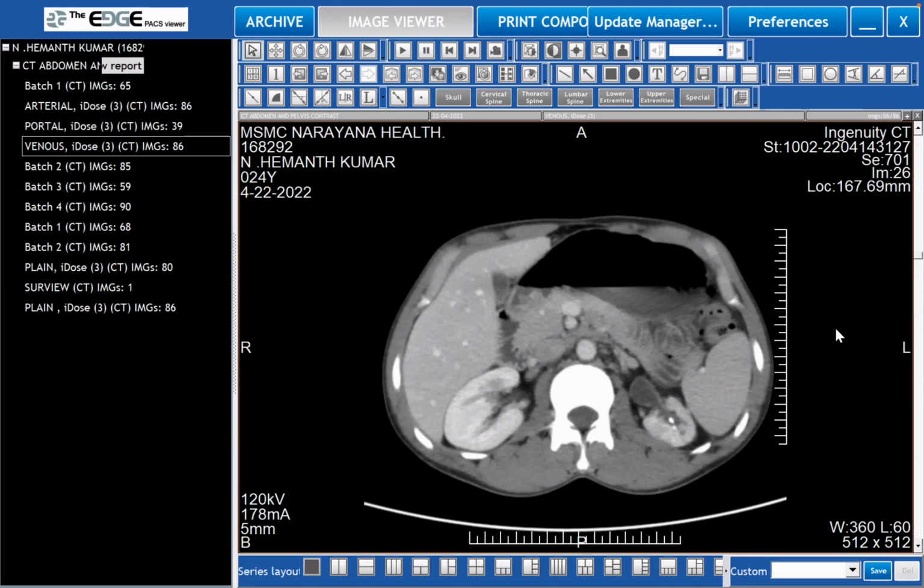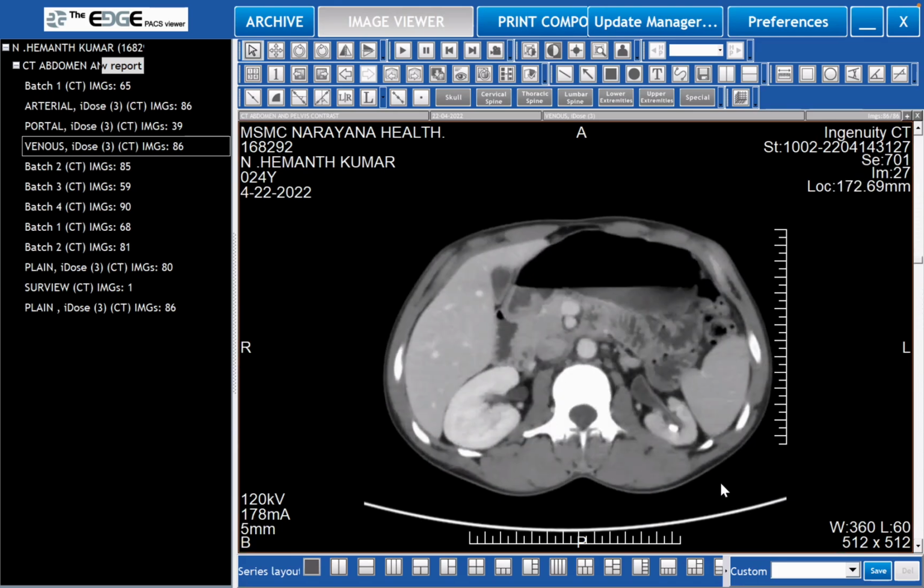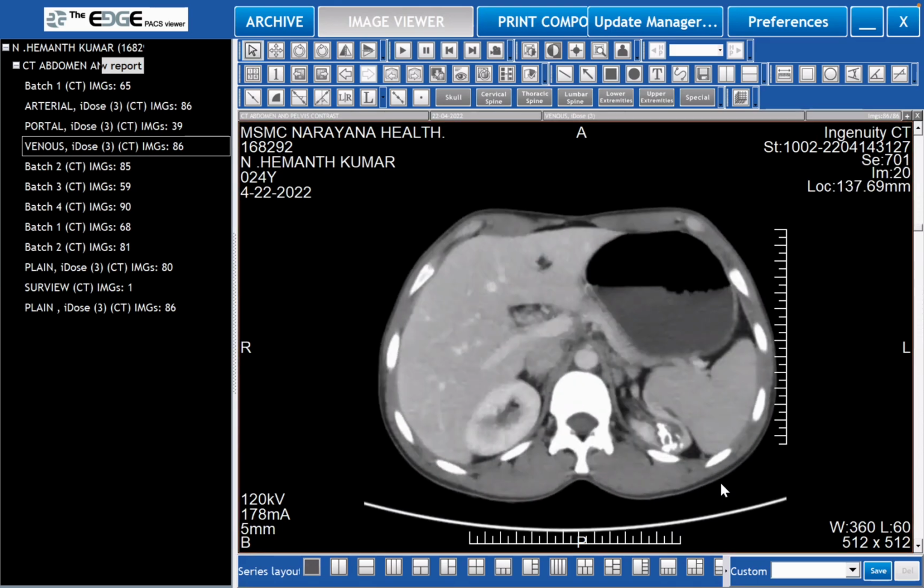So what is the other reason why you should not give lithotripsy to this if it is a stone? Sir, it's already a contracted kidney. You agree, that is one reason. Is there any other reason, which I have shown you in this cut? Sir, this radiopacity doesn't seem to be a stone. So if it is a stone, one contraindication is poorly functioning kidney. Any other contraindication?